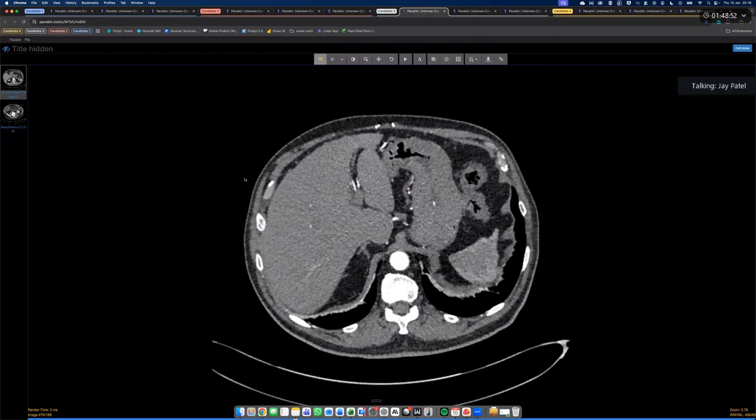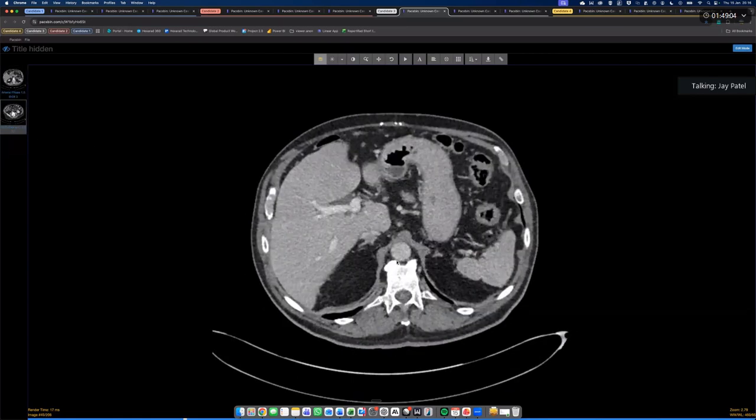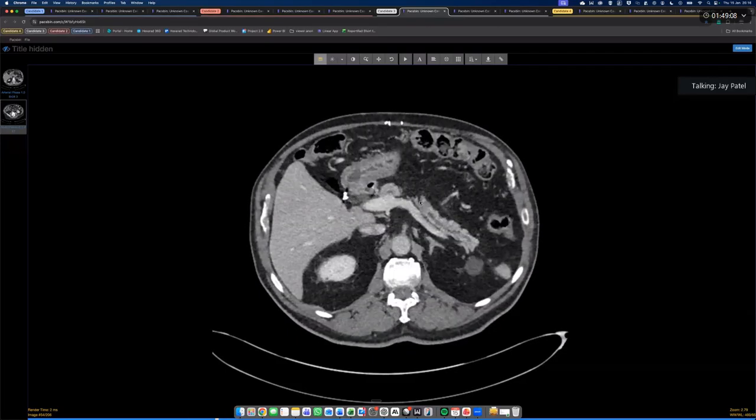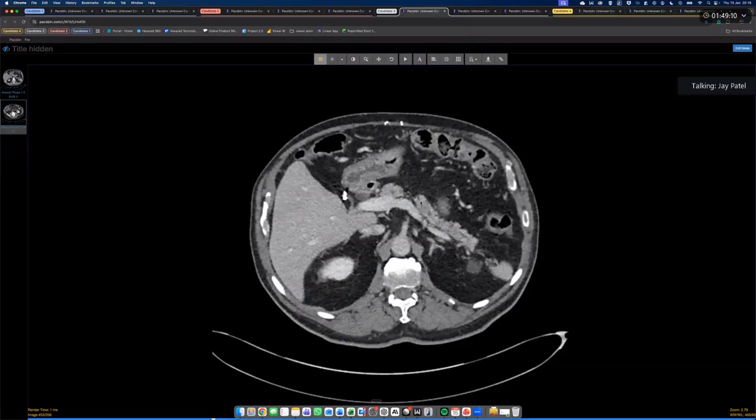What nuclear medicine scan would I do if I'm looking for a neuroendocrine tumor? Do you know? Is it the DOTA scan? Yeah, great. Gallium dotatate PET would be what I would use as first line. Well done. So this is the abnormality here. It's subtle, isn't it?